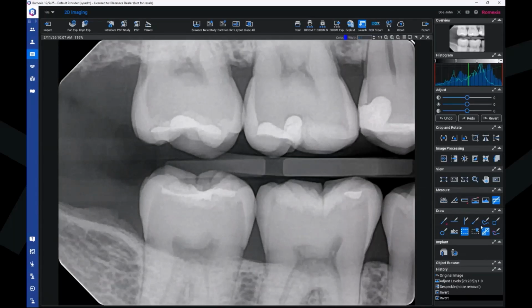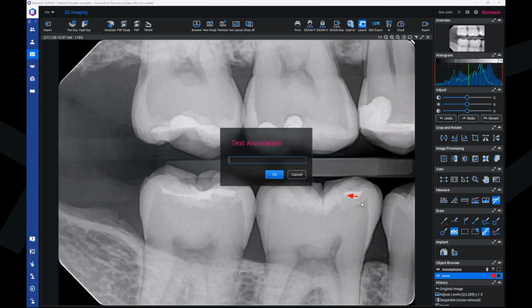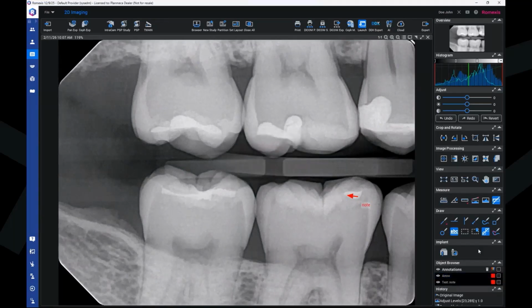And then we have all the different drawing tools. There's again draw line, which also has the draw polyline possibility. Below you can draw horizontal and vertical lines, add arrows for marking something, and add text here like that. Those annotations, just like the measurements, are added here in the object browser below. And again, the same way you can hide, show and delete if needed.